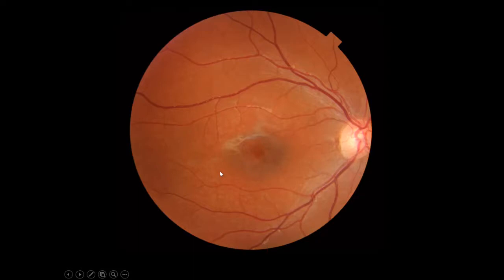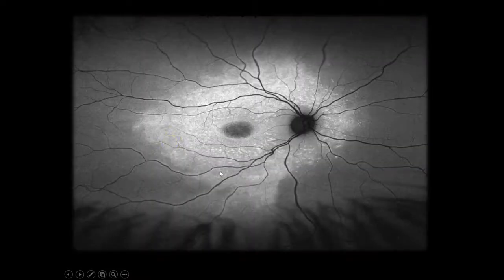However, one simple autofluorescent image shows over here that clearly the macula is too dark. It's oval. It's darker than it's supposed to be. That's hypoautofluorescence, which means that the retinal pigment epithelium is missing. The other important factor is when you lose the RPE, you also lose the photoreceptors. So he would be expected to have central acuity loss. This is right in the macula.